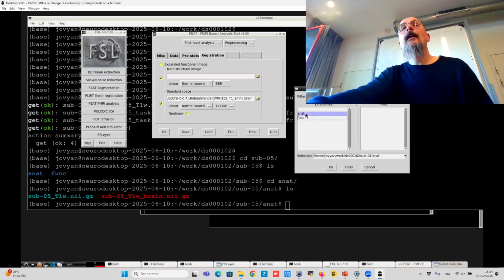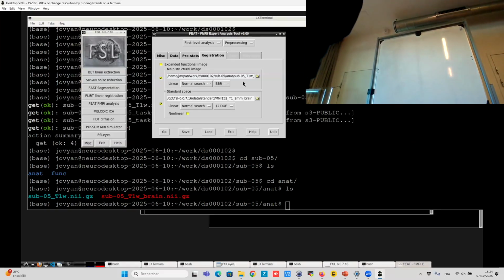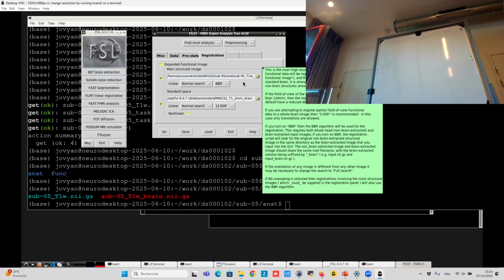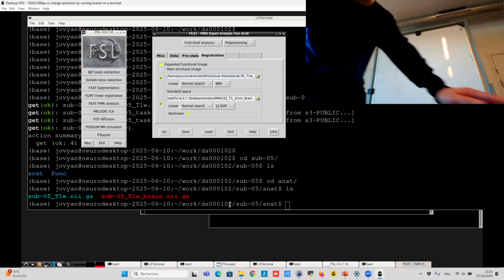What? Not this one. So if I'm missing, okay, not that. Okay. You click OK, and it should appear in the blank part here. Everybody's loading the proper images? Yeah? Okay, look, let's change some options and I will show you why.